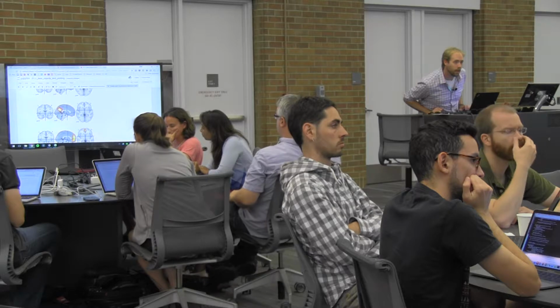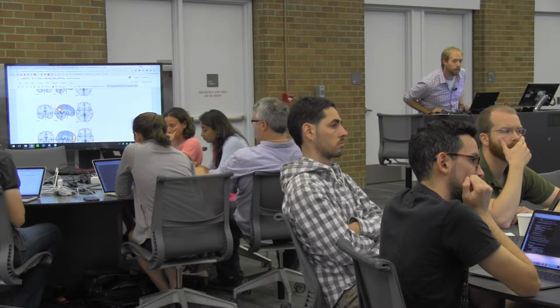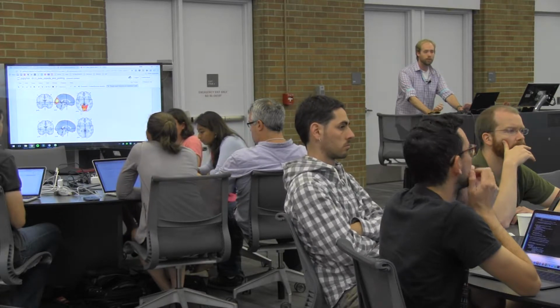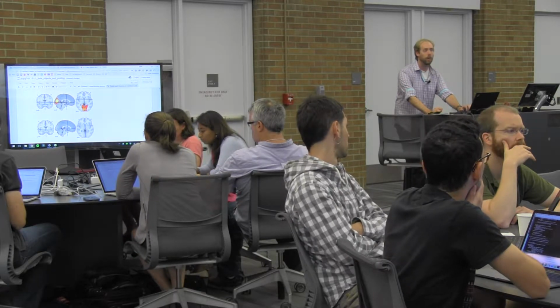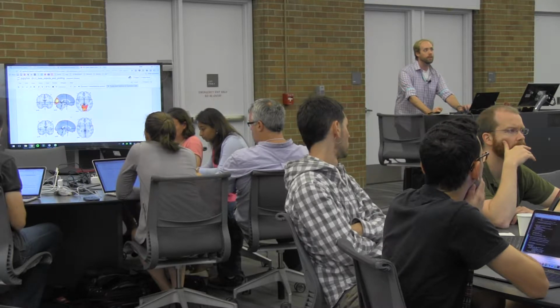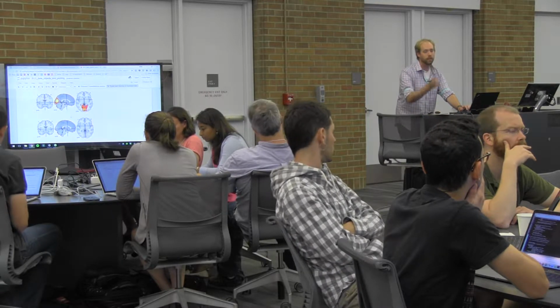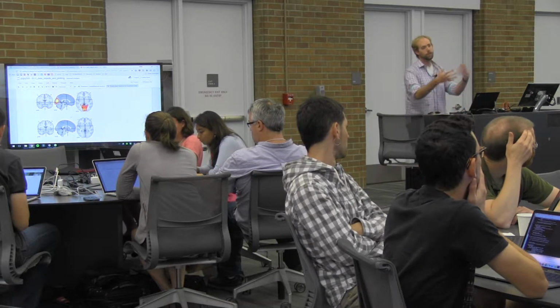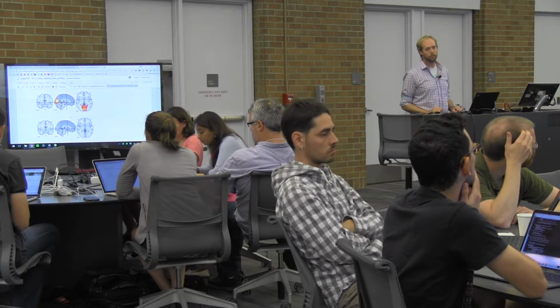What's that? It plots across. Uh-huh. So that's not on where it should be. On the coordinate. Oh, okay. Yeah, so in terms of defining where the cut coordinate is, you can tell nilearn to do that in different ways. So there's, I think, a parameter that says choose the cut coordinate so that it's at the maximum of the activation in the map or something like that. But those are other things that are exposed to you as parameters you can play around with.